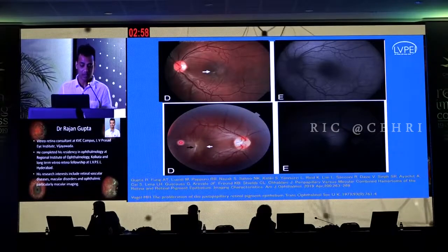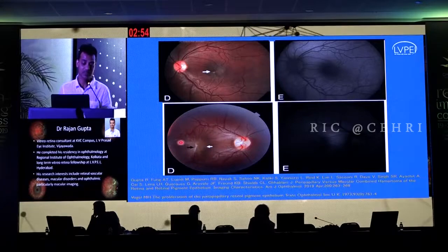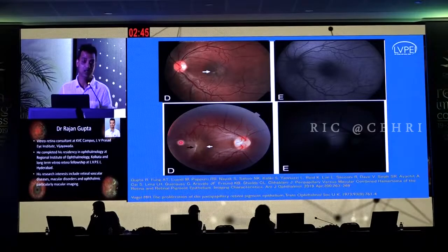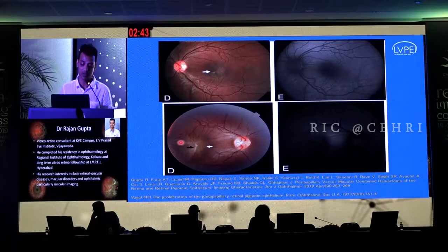The pigmentation, however, which we see in the macular cases is not the kind which we observe in the peripapillary cases. It is a subtle, attenuated, deep subretinal hue which we observe in the macular cases, which does not alter the hypoautofluorescence pattern at the macula.